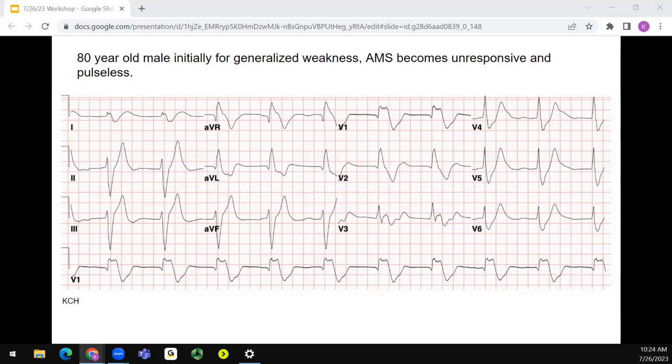You guys should, especially being a county hospital downstate, have this pattern memorized. You have right axis, there are no P waves, there's a wide QRS, and the T waves are peaked. This patient actually arrested like 10 times, I remember. He got so much calcium, his calcium was like 14 or 15, and he actually did well.